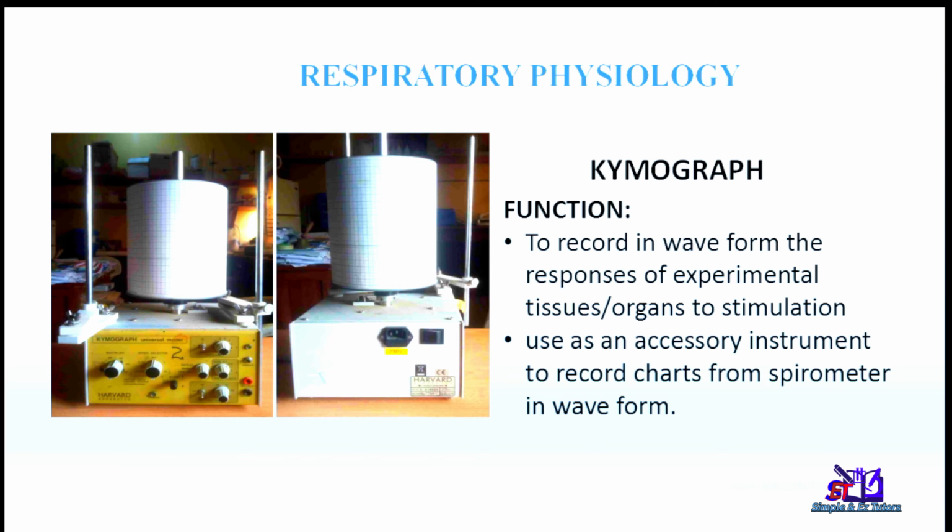It's actually an old instrument that has been replaced by Powerlab, but it was used to record in wave form responses of experimental tissue or organ to stimulation for experiments like nerve and muscles, simple muscle twitch, wave summation, genesis of tetanus, and the rest of them, properties of cardiac muscles. But in respiratory physiology it is used as an accessory instrument to record charts from spirometer in wave form.